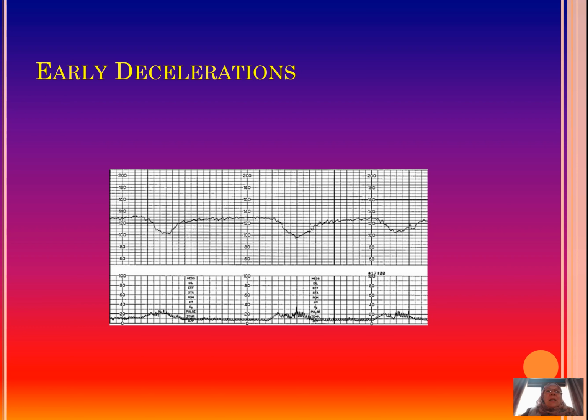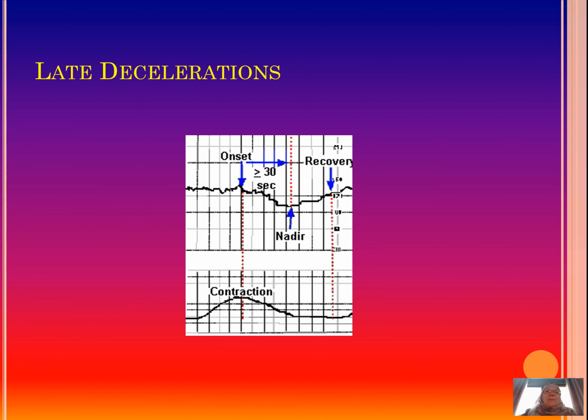Because they represent fetal head compression, they usually occur in the advanced phase of the second stage, when the baby is deeply engaged in the maternal pelvis, and therefore they are not as common as other forms of decelerations.